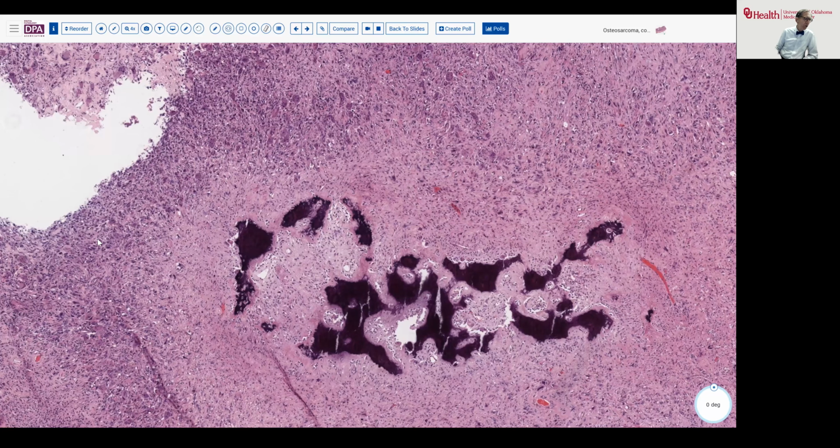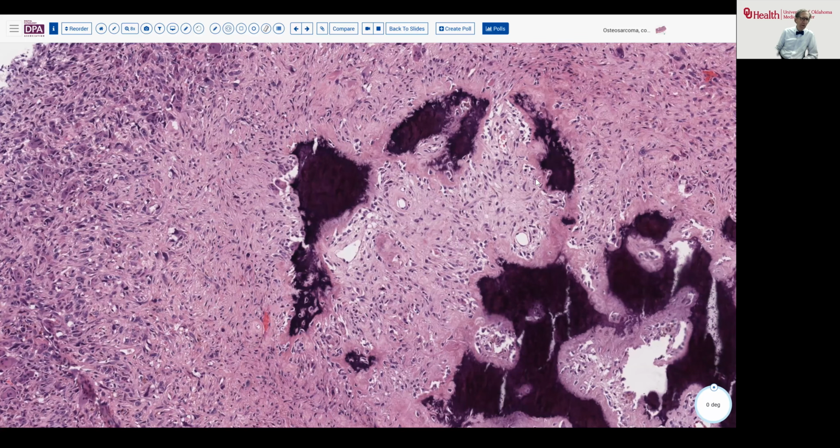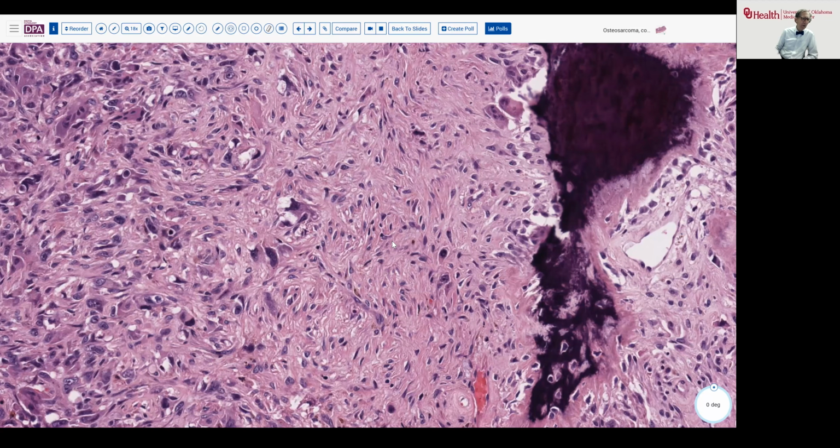So we have cellular tumor around the periphery of this area. And you can see we've got these pleomorphic cells, some giant cells admixed with this, and then this more collagenous matrix, and then the bone. And notice here in this bone that the internal structure is fibrotic, yes, but it lacks the degree of atypia that we see over here. The high N/C ratio, the variable nuclear size and shape, angles, and so forth are not seen in this situation.